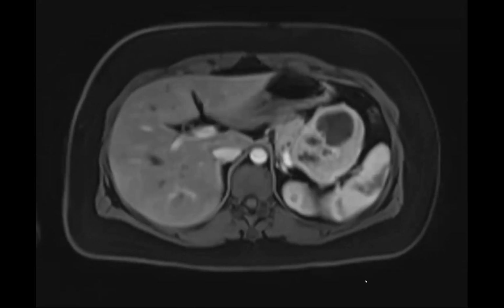And this turned out to be a neuroendocrine tumor. And just a few points about cystic neuroendocrine tumors. About 15 to 20% of neuroendocrine tumors can be cystic, and they have a better prognosis. In general, neuroendocrine tumors tend to be hyper-enhancing, but these cystic ones have these cystic spaces. They're not necessarily from necrosis, which is not a sign of aggressiveness or outgrowing its vascular supply.